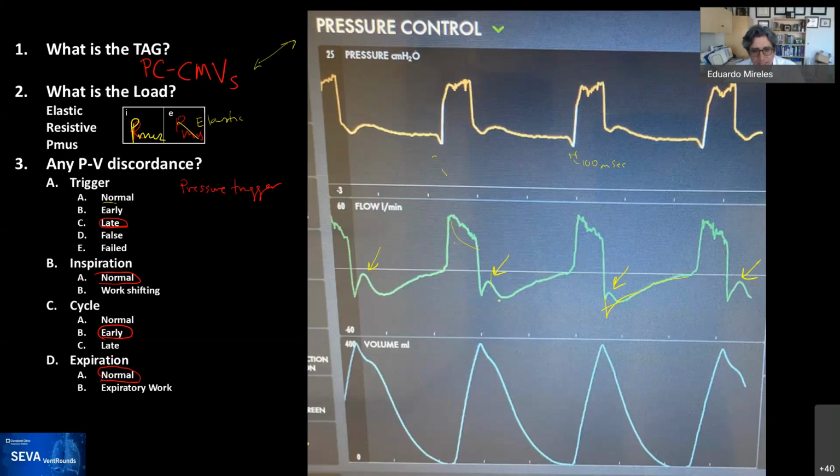I think that settles that the type of work depends on what the situation is, what you're facing as you're exhaling. But the reason I said that is because I see the decay over here, and it looks very nice. Is this the initiation of it active? I don't necessarily think so. I think this is just the ventilator trying to adjust for the patient, relaxing the muscles and going out, and the rest of it is pretty passive.